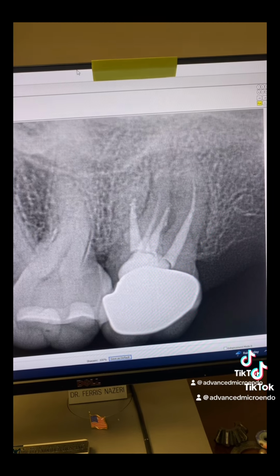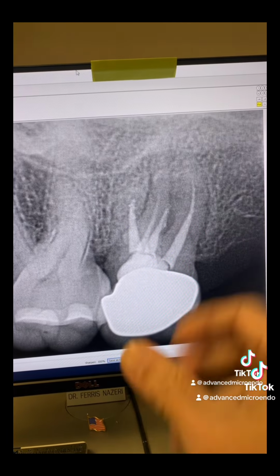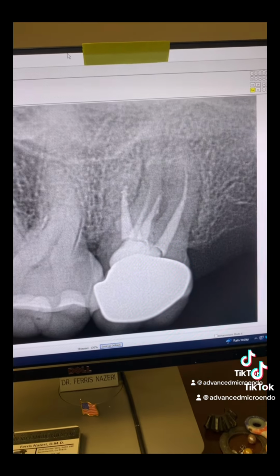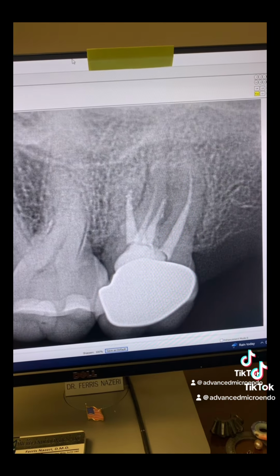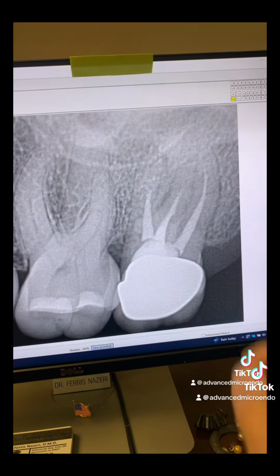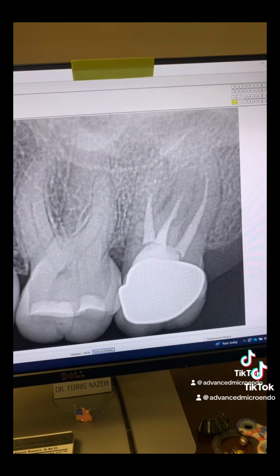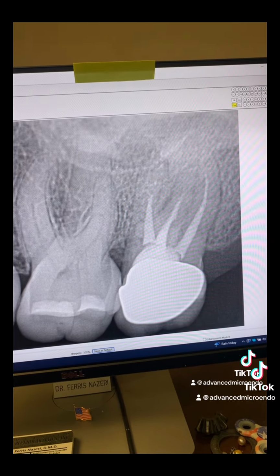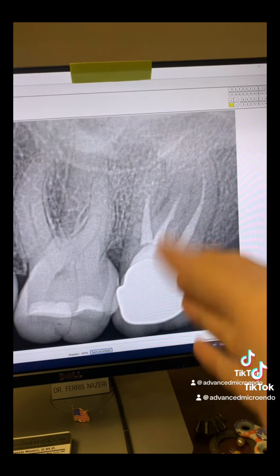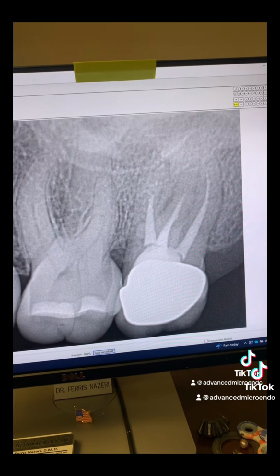That's why there's a sinus tract there. There was a buccal parulis. So if you had just relied on one x-ray, you would have missed all of this. You would have recommended the root canal to be redone, just like what her dentist recommended, and that's why the dentist referred her to us, because he or she just relied on one x-ray.